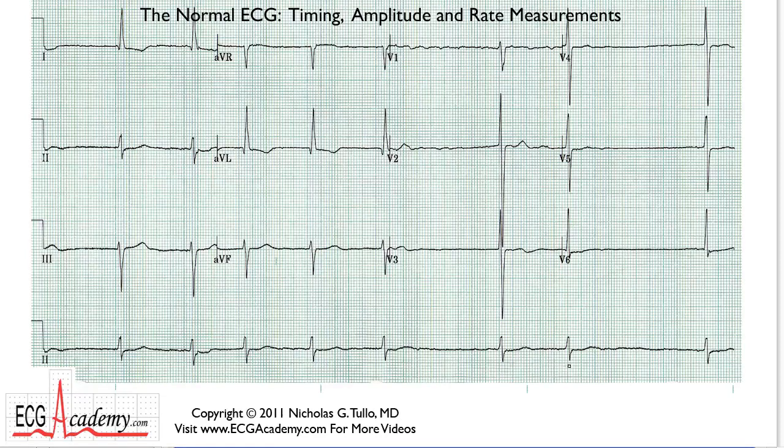the heartbeat is irregular. And you can see some of these intervals are actually very short, and other intervals are very long. Determining heart rate is a little tricky because depending upon which interval you measure, you could get vastly different heart rates. So calipers aren't terribly useful under these circumstances, but I'm going to show you something that is useful.